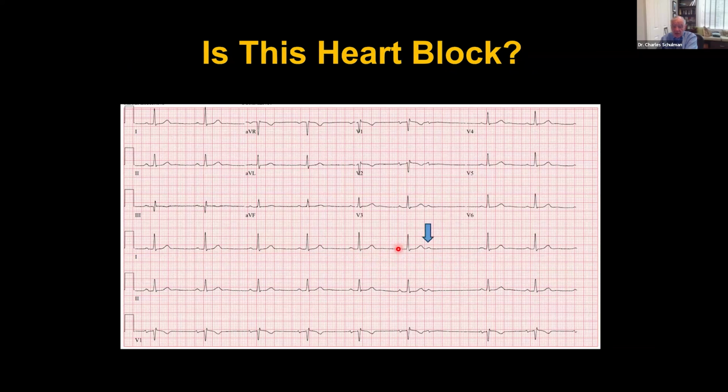So the next P wave, which ought to be about here somewhere, is not. There's a premature P wave. And this is a blocked PAC, which is the cause of the pause. A common cause of the pause, but not heart block.